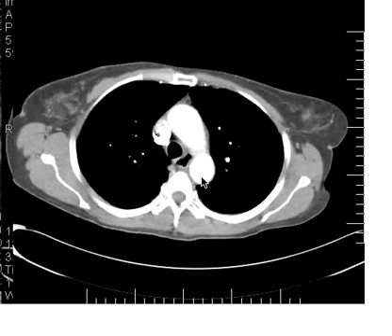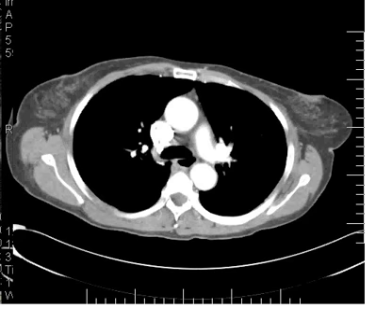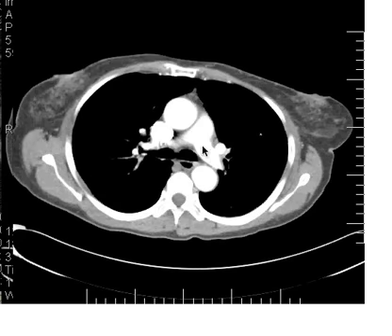The key concept about the pulmonary artery is that it branches under the arch. So if you think about that, then you go lower and you say, okay, here's the pulmonary artery, and it's branching under the arch. Well, which is the main pulmonary artery and which are the left and right? Well, the pulmonary artery dives posteriorly as it exits the heart. So this is the main pulmonary artery coming back like this.